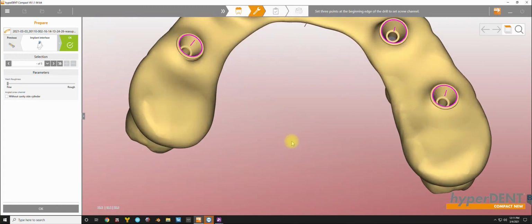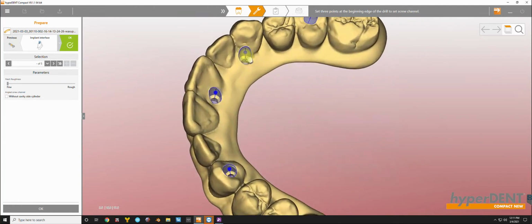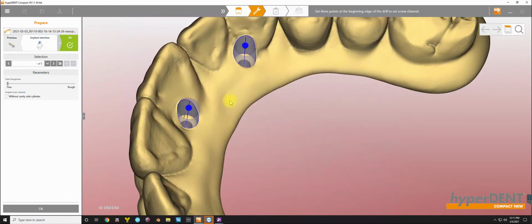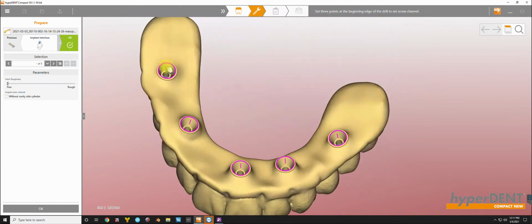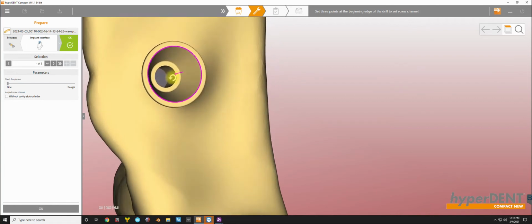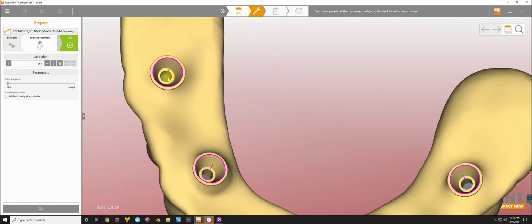Okay, so right off the bat, I believe that this is a custom geometry for a special screw. I do see an issue right off the bat, which is always good to check if you're having to manually mark stuff. We want to see that blue screw channel come all the way to this edge right here. If not, Hyperdent will still allow you to mill this part, but this through hole where the threads of the screw go will not be complete.